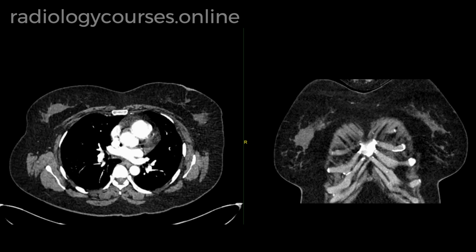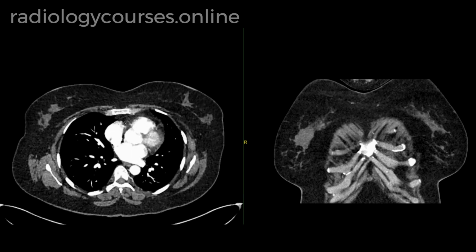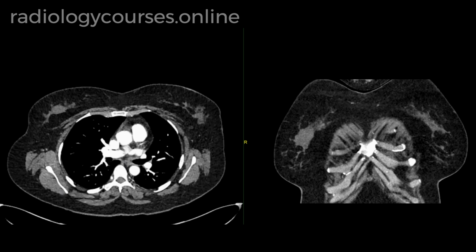Based on the breast team review, further evaluation, including review and discussion in the breast MDT, is advised, and I would flag this report as urgent. So, in summary, here I have shown a case of an incidental breast mass on a CTPA, and I'm showing how to report and flag the report.